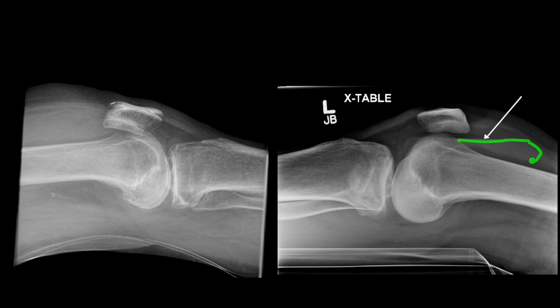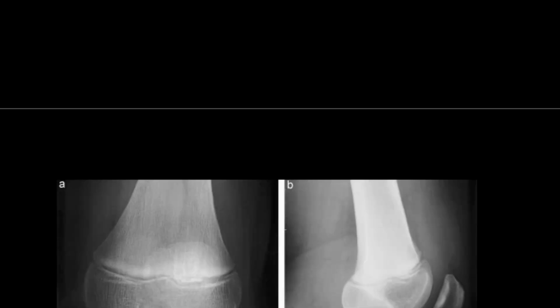So ultimately, when you get bleeding into the joint, often following trauma, you can see this when the x-ray is taken with the patient supine. This is important because sometimes fractures might not be as easily visible, or damage to the ligaments and so on in the area. Again, we can't see them very clearly, but this sign would suggest an injury.